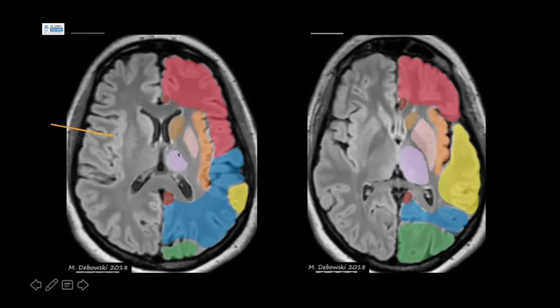And then this structure here is the thalamus in the light purple. As Dr. Khan already highlighted, this is the anterior limb of the internal capsule, the genu, which is knee in Latin, so the bend, and then the posterior limb of the internal capsule. This is the external capsule, and this is the Sylvian fissure here. We can see it pointed out on this side. And immediately deep to the Sylvian fissure is the insular strip.